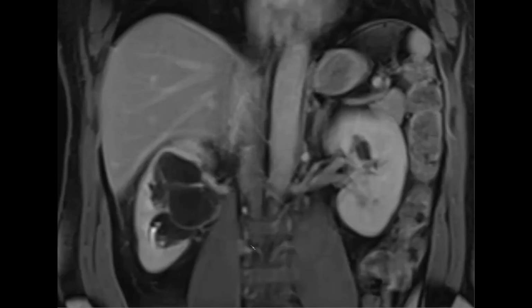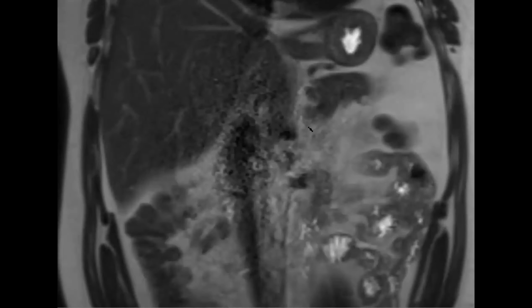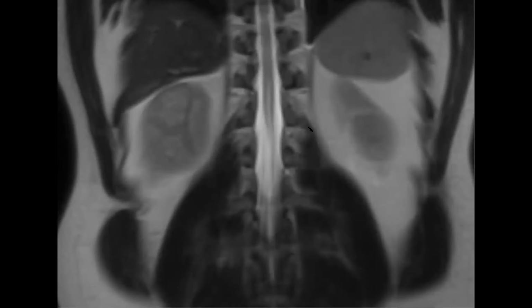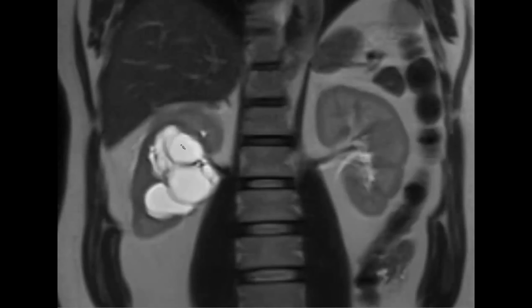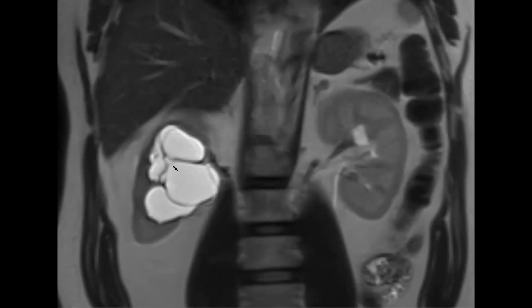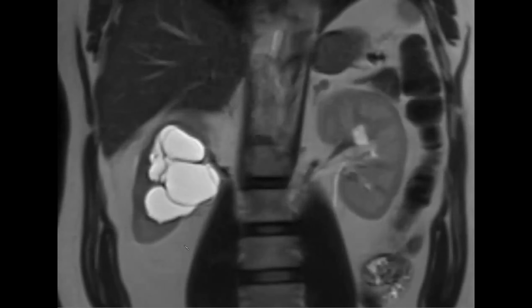You know, these lesions tend to protrude into the renal sinus fat, and they are multicystic, almost like a Bosniak 4. But when I hear all of that, I think about multilocular cystic nephroma, or MCN, which herniate into the renal pelvis. They overlap with Bosniak 3. They have multiple septations. They're seen in young boys and middle-aged women.